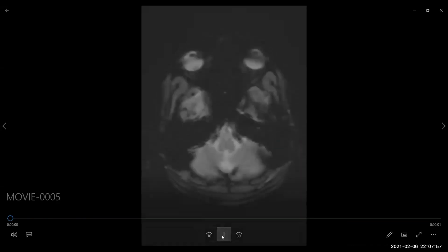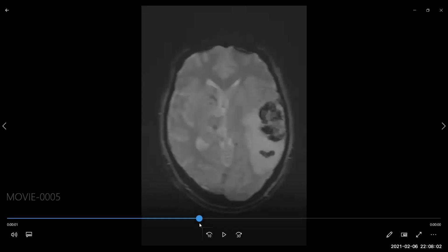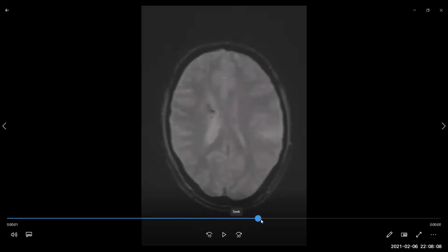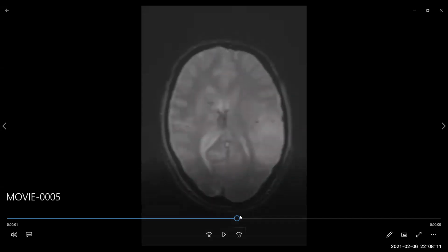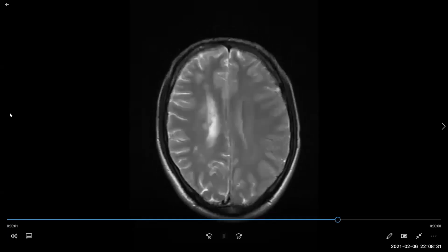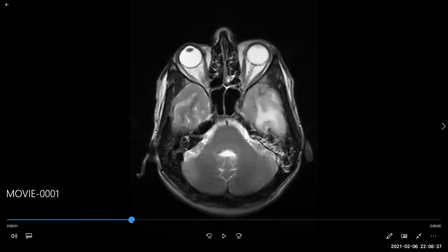Yes, you have this. So this is the SWI images where the T2 hypointense areas are blooming. So they are the areas of hemorrhage, I think. This could be a patient coming with a collapse. It can be an intraaxial hemorrhage causing these symptoms, but it's not a typical location of hypertensive hemorrhage.